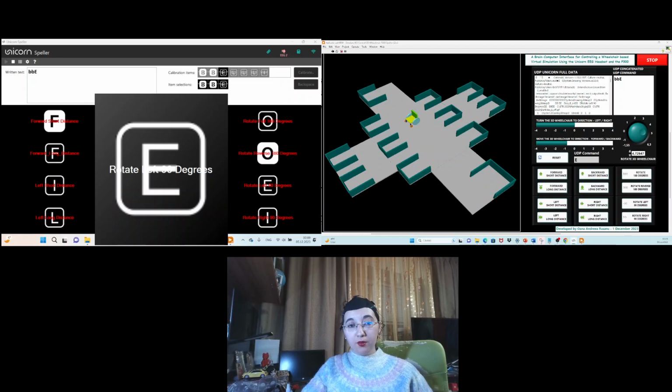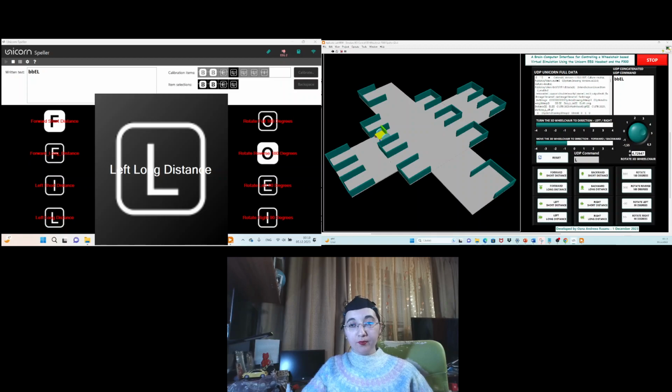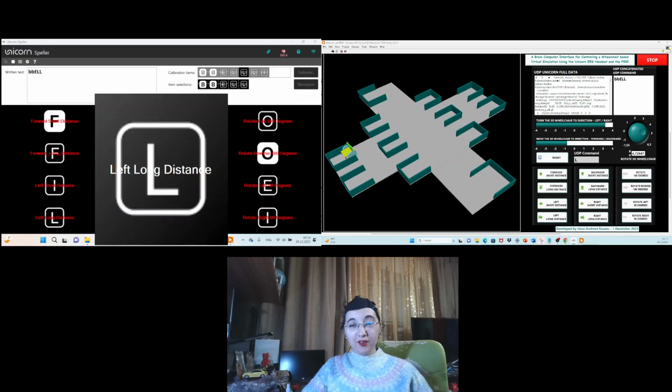That's great. Continue with left long distance for 3 times. Super. Okay. It's really cool.